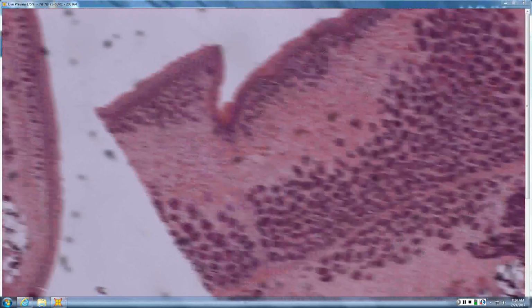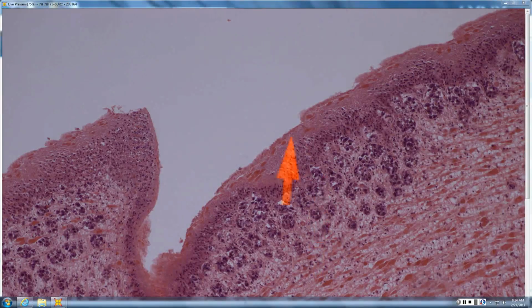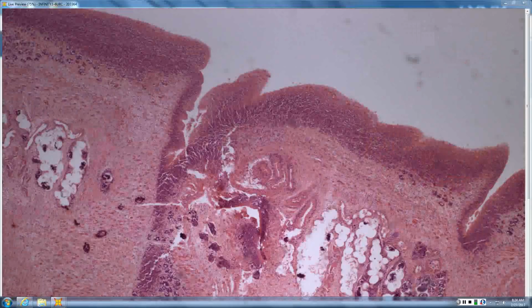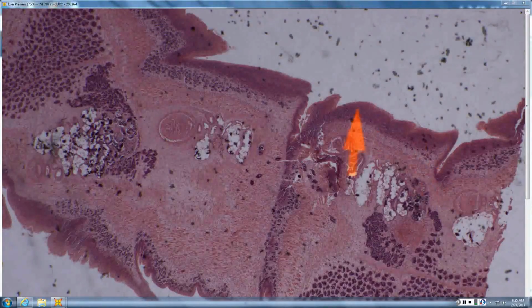What type of one was it? Yeah. It's definitely a worm, maybe a very large worm, like a flatworm. So first off, it has no gut, right? It has a calcareous body. It has smooth muscle. It's much larger than what we saw before. And it seems to have constrictions.